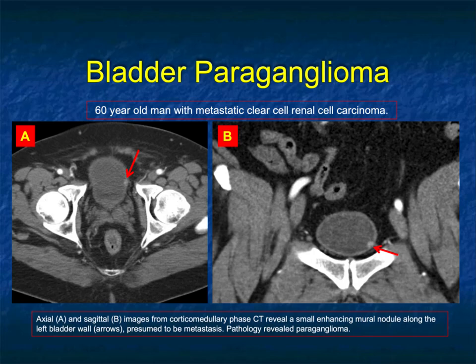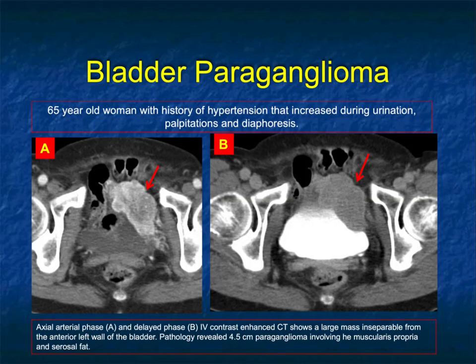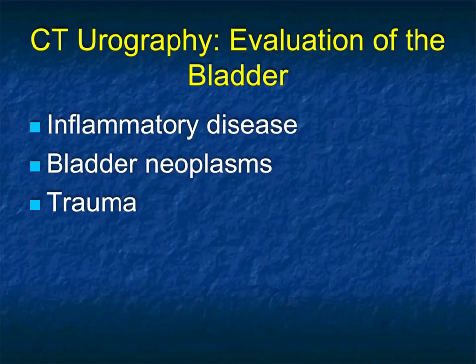So at times, vascular lesion, though it's not hypervascular, this could have been a MET, but it also could be a primary TCC. And here's another bladder paraganglioma, a larger one, but you can see how vascular it is. That's far more vascular than a TCC, or even a squamous cell, or an adenocarcinoma. Mass, very vascular. You've got to be thinking paraganglioma. Very important diagnosis.